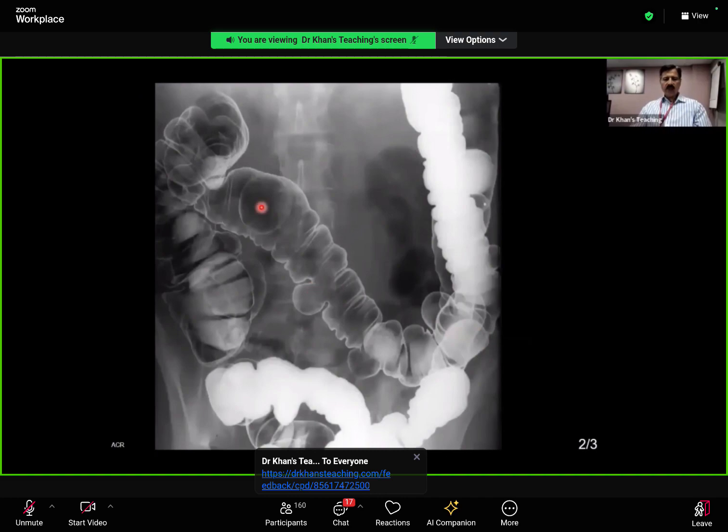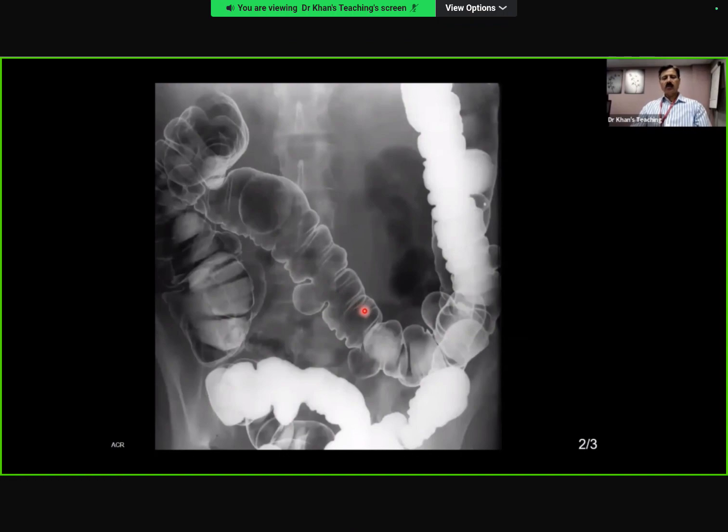Now, this is what we were talking about. That film was decubitus. Here you can see these pseudo-sacculations. Now, what happens? This is what we call hide-bound bowel, just like skin, you can have hide-bound bowel in scleroderma. Basic pathology is that the muscularis propria is replaced by collagen and fibrosis. So it becomes sort of weak. So there is no muscle here. Because there is no muscle, it is replaced by collagen and fibrosis.